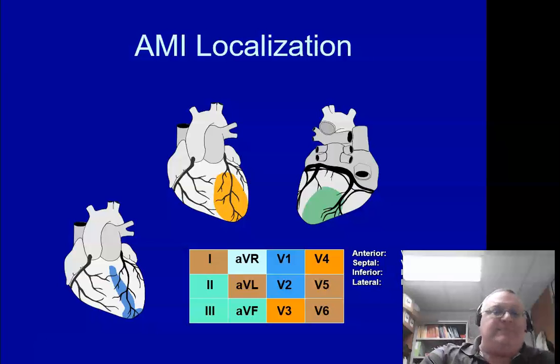Now, Scott, why does it make a difference? They got ST elevation. We just got to get them to the cath lab. Except for, are the complications from these heart attacks very different? Let's do a little overlay here. SA node, AV node, SA node, AV node.